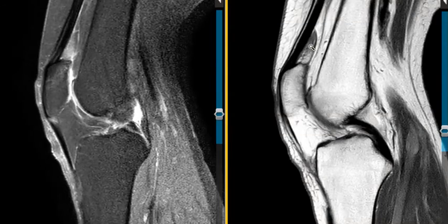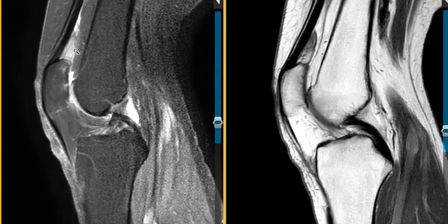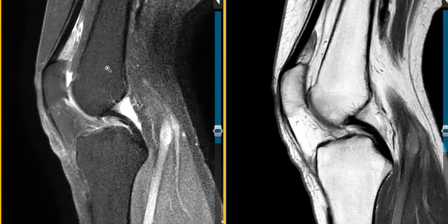And this should be really bright here, like the other fatty structures, but instead it's dark. So this is abnormal. It's a little bit plump too. Normally this is very small. This is a little bit enlarged and abnormal in signal on this. So we're going to look on this one that's really sensitive for inflammation, and we see that there is brightness up here. This should be fatty, like here or in the marrow, a dark wedge, but it's a bright wedge, so we know that this fat pad is inflamed and swollen.